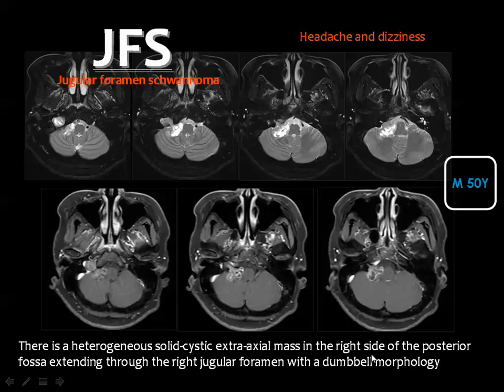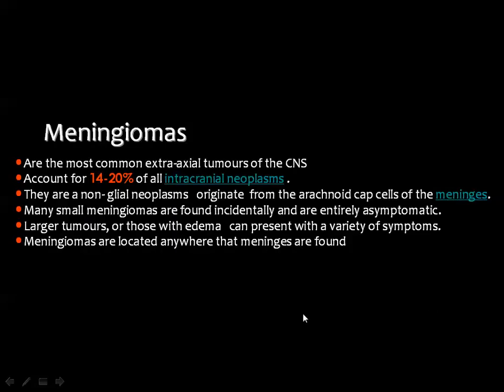And here you can see a jugular fossa schwannoma. It has a cystic component outside the jugular fossa and another component inside the fossa with heterogeneous post-contrast enhancement.